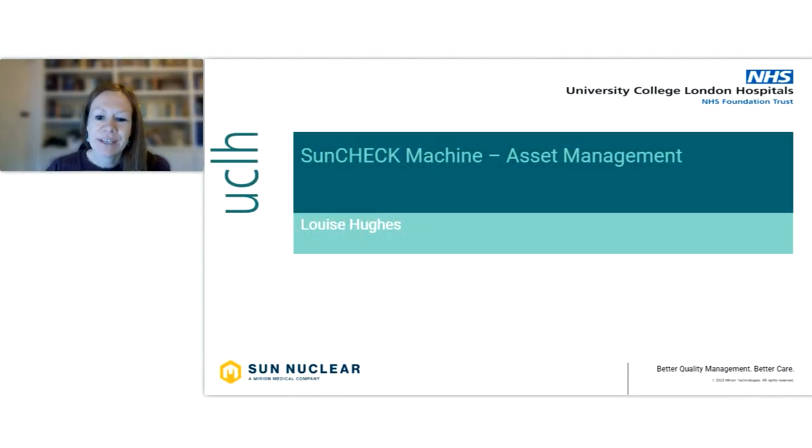So I'm going to give a quick tour through the asset management function of SunCHECK Machine, what it is and how to use it. I'll also cover some things you might want to consider in your institution when you're setting it up, some tips and things to watch out for, an example of how we're using it at UCLH.